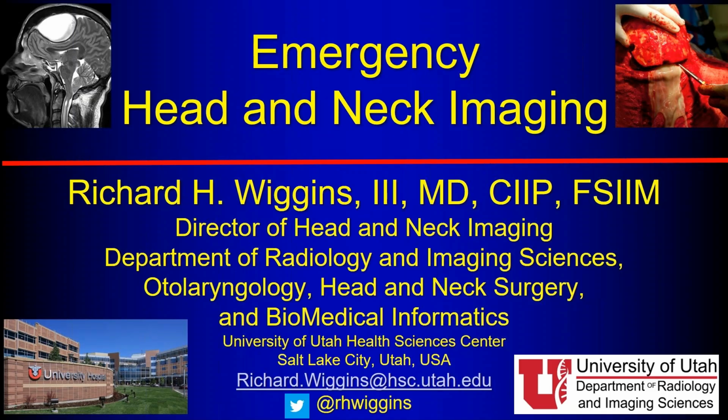Specifically in the head and neck world, we have all these parts that are very different. So how we think about the central skull base and the cranial nerves and the extracranial head and neck and the orbit and the paranasal sinuses and the temporal bone for head and neck imaging, there are all these very different places. So we're going to talk about the similarities and differences in these next two lectures as we look at emergency head and neck imaging, and then in the next hour we'll look at central skull base.